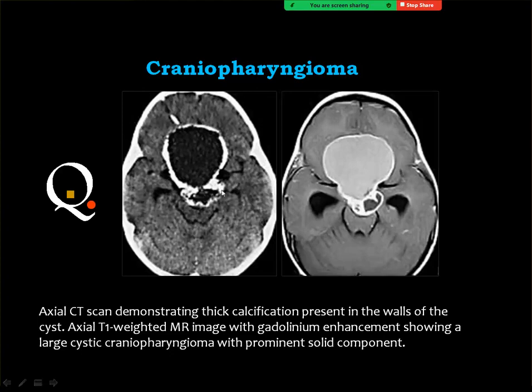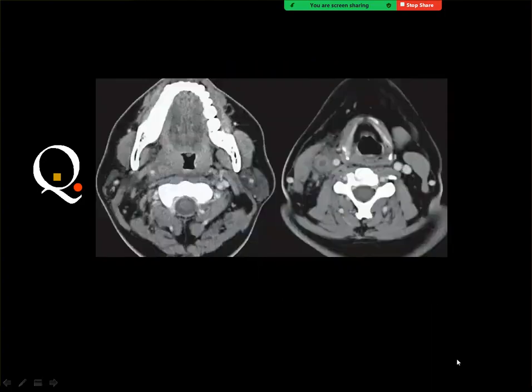And in the lectures, I said if you are interested to see calcium on MRI, you should have the gradient image or the susceptibility weighted image. But even this very dense calcium is not seen in MRI because of the minor sensitivity of MRI to calcium.